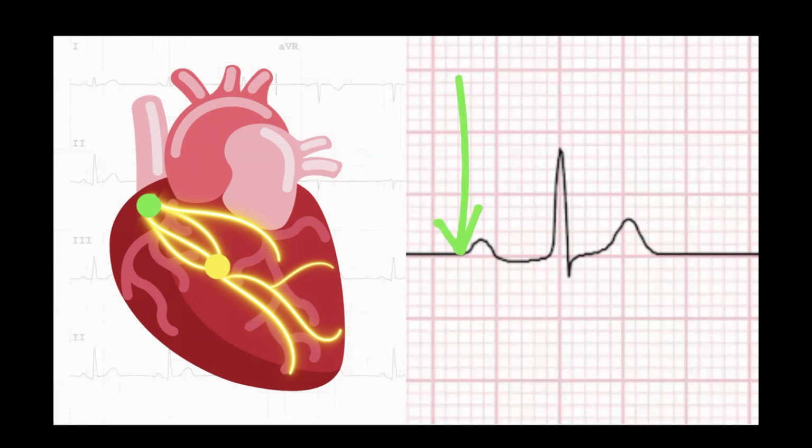So going back through the basic squiggles here, we have our P wave. How does that P wave happen? Well, first off, the SA node, which is very minuscule in terms of energy, triggers its initial impulse, which creates the rippling effects. The SA node fires right here, and that firing goes down those interatrial pathways, like you talked about.